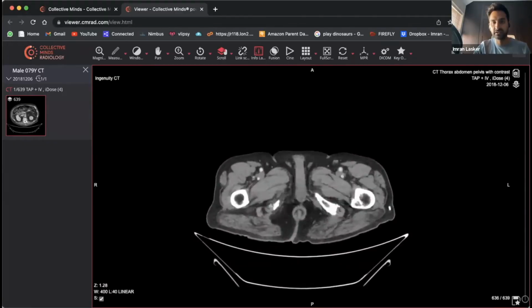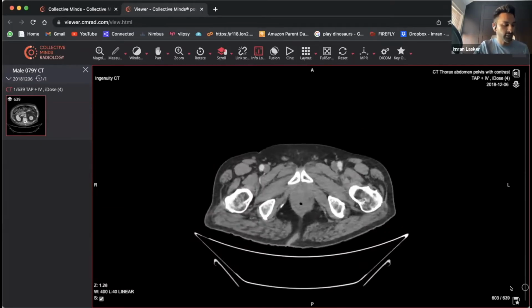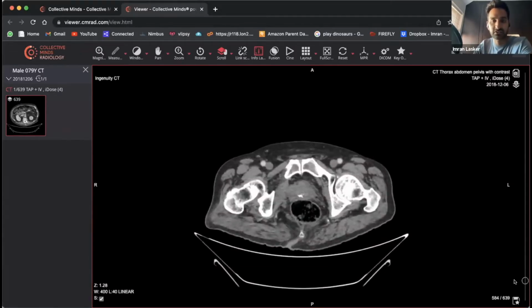We can't stop there. We also have to look at the bowel, because people don't turn up like textbooks, and part of being a radiologist is that you're still looking for other things once you've spotted the first thing. What I often say is it's the second fracture that gets missed. Most of the time, it's not the first fracture that gets missed, it's the second fracture, i.e. what I'm talking about is satisfaction of search. We do have to keep looking.